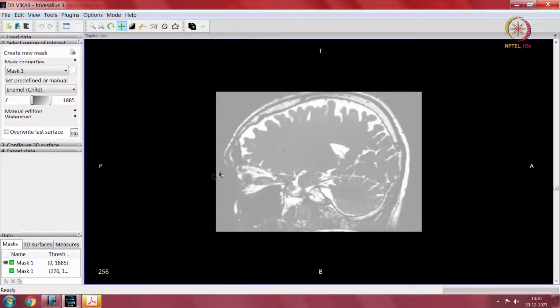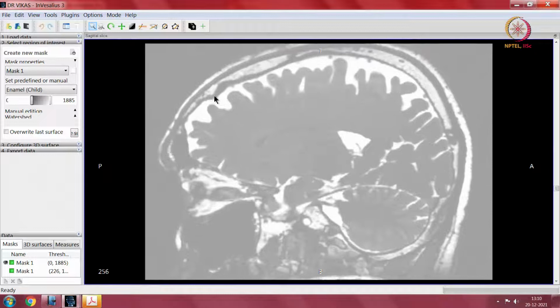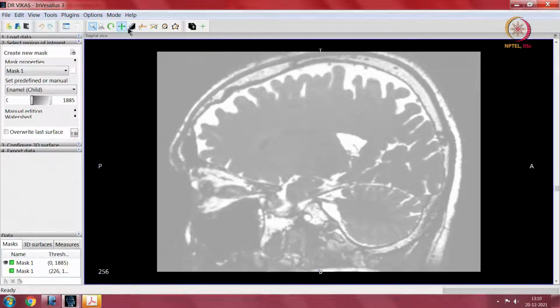So, this is anterior. Now, I have done an image flip on this, the marker still shows it posterior and anterior. What structures are seen now would need to be explained. A more distinct understanding of the tentorium, the supratentorium, is over here.